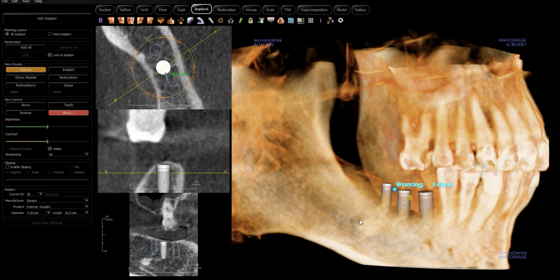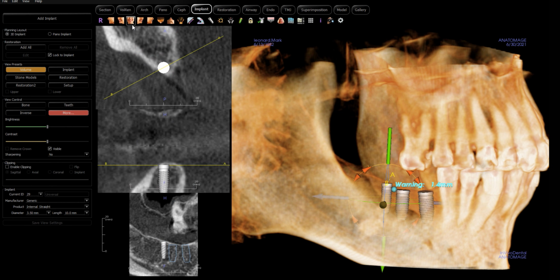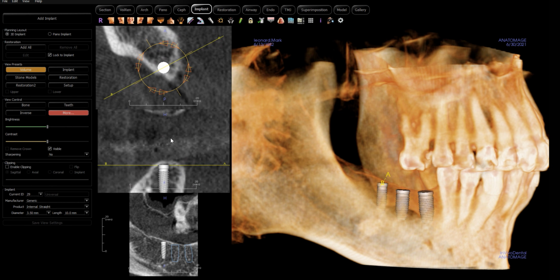I'm happy with that. It's pretty uncommon that you're going to have wider bone in the premolar area than where you have the implants placed in the posterior. With that said, I think this looks pretty good. So we're going to say 3.5, or sorry, 4.5, and then bring that implant out. All right. Now we're going to do the same thing on the final. Again, lots of bone, uncommon. Let's go 4.5 here also.